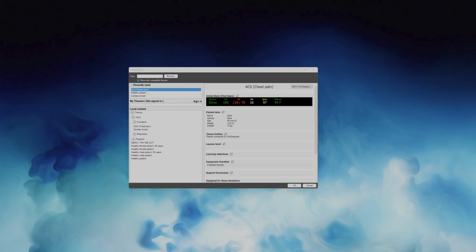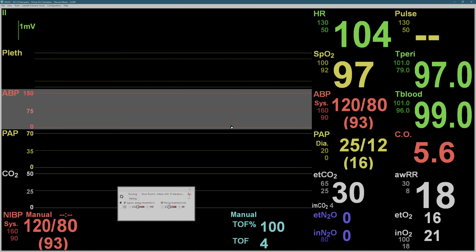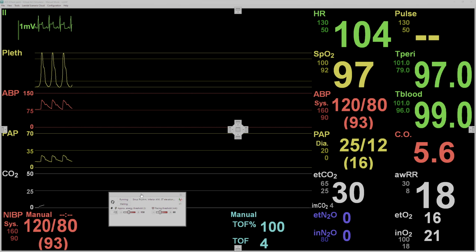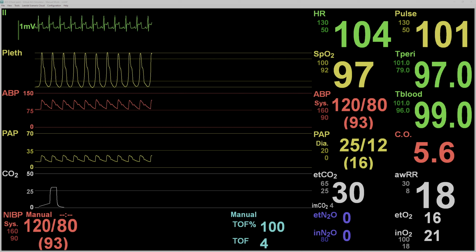Alright, so here's a view of the Laerdal app. You can set patient information, patient settings, initial vital signs, all that. It's the rhythm generator. Here's our initial rhythm. I usually keep this on the screen below. I have two screens running.